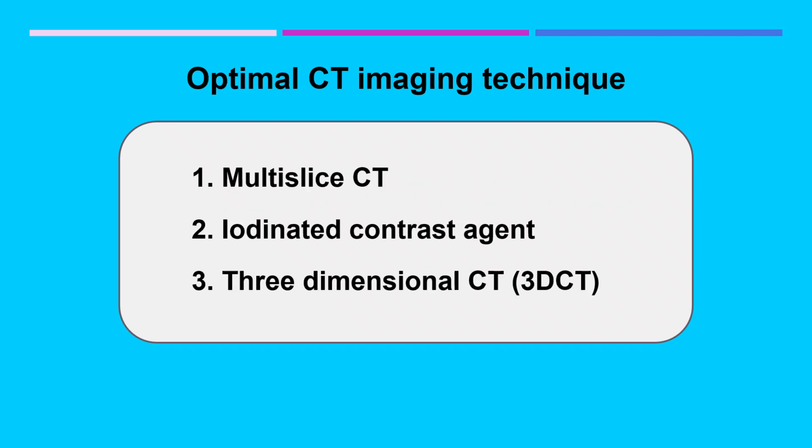For accurate staging, several technical factors are essential: multi-slice CT, iodine contrast agent, and three-dimensional CT reconstruction. These techniques together provide high-quality and comprehensive diagnostic information.